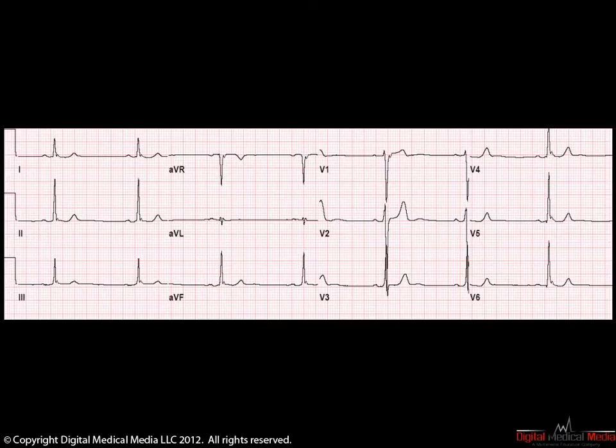At the very end of the QRS is an upward rising to the J point that immediately plummets back to baseline. This abnormality is best seen in leads 1, 2, 3, AVF, V4, V5, and finally V6. This is called an Osborn wave. An Osborn wave is quite rare because of its cause, but is essentially diagnostic of the problem.